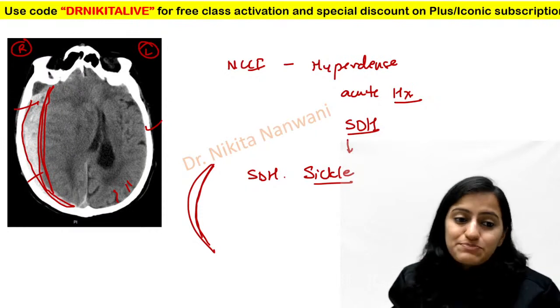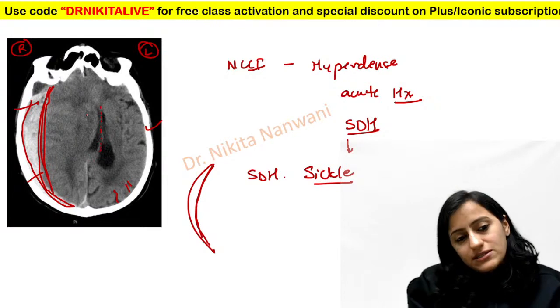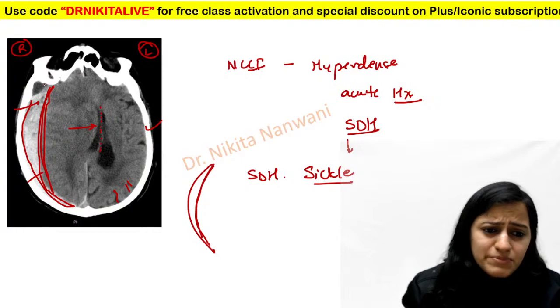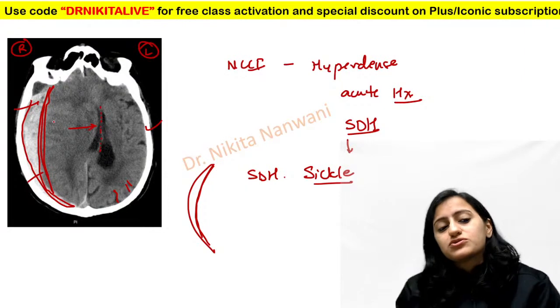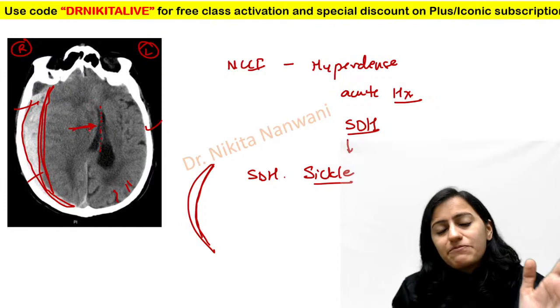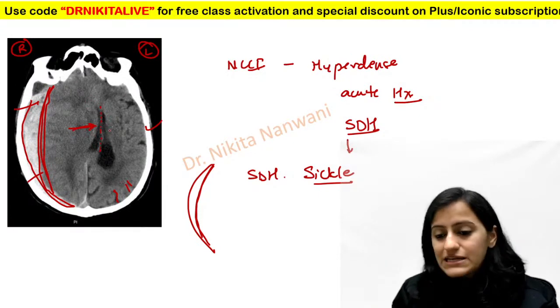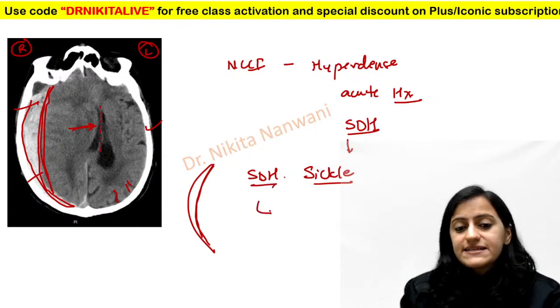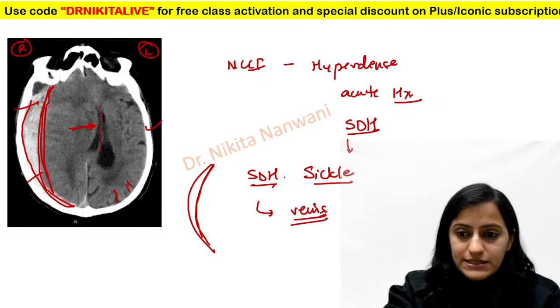Yes, there is this midline shift. You can see that this is the midline in between the lateral ventricles. And you can see there is midline shift to the opposite side. Why? Because this hemorrhage is causing the mass effect. It is pushing the structures to the opposite side. So there is significant midline shift. There is subfalcine herniation. So we need to intervene in these cases. SDH is due to rupture of cortical bridging veins, right?